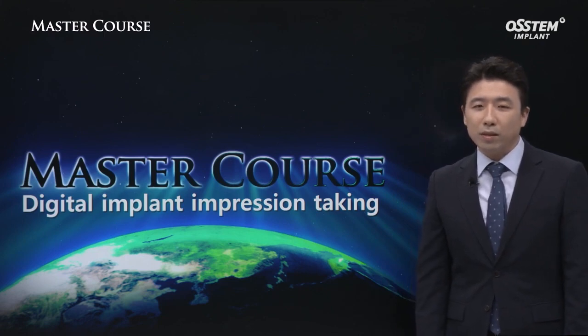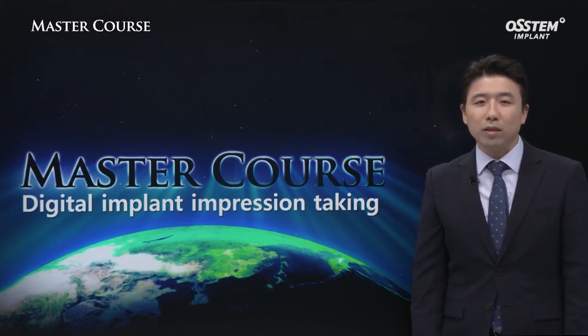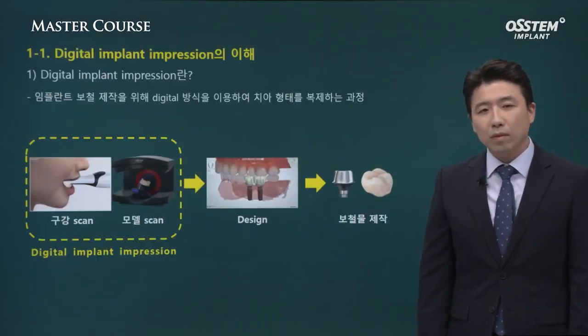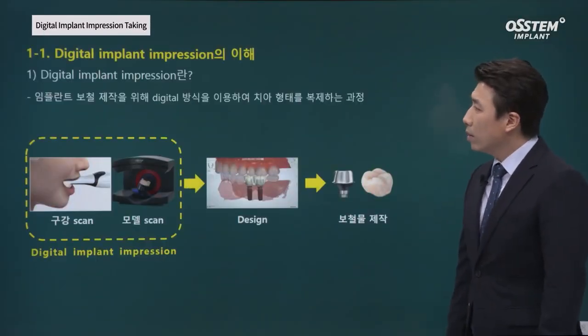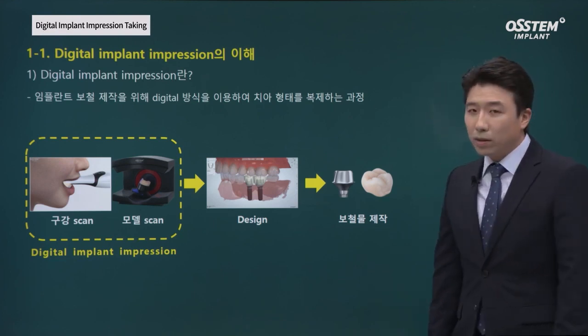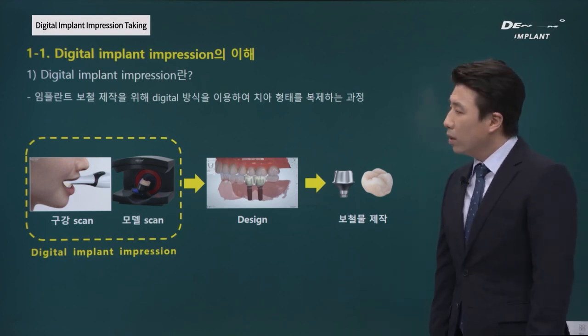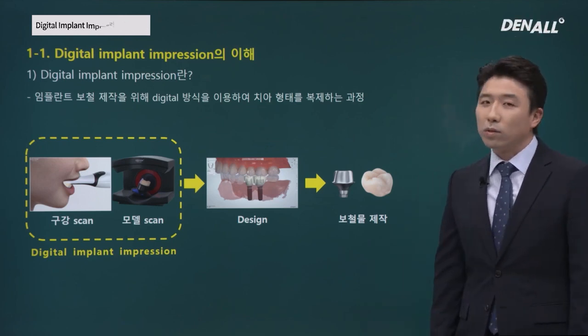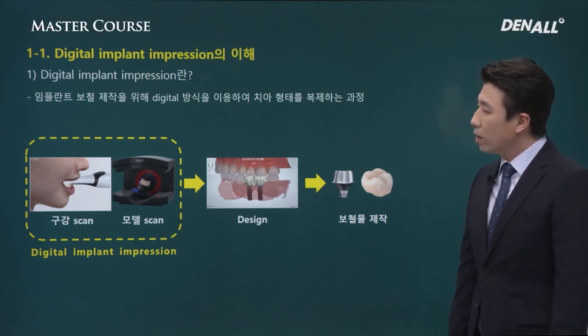Today, I'm going to talk about the digital implant impression taking process. Digital implant impression taking. Recently, we use intraoral scanners for that quite a lot.